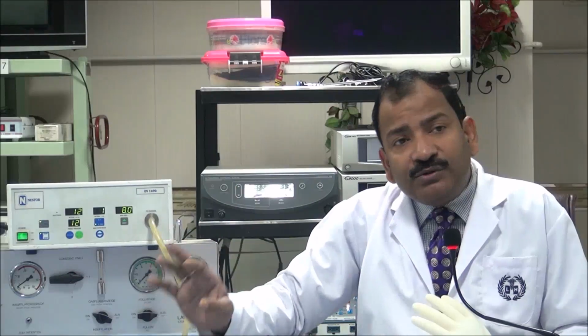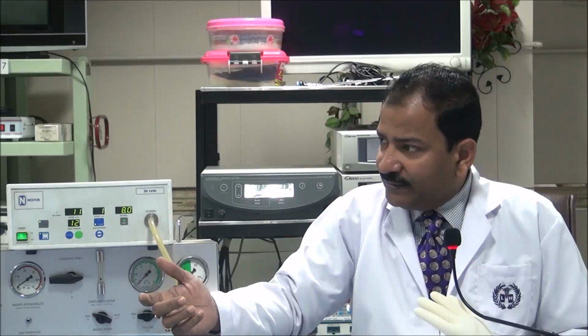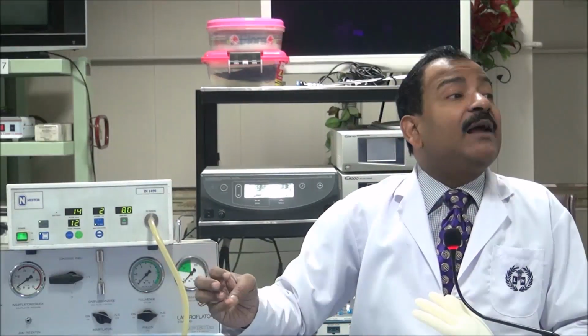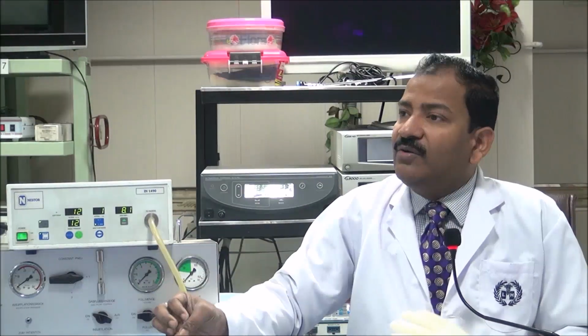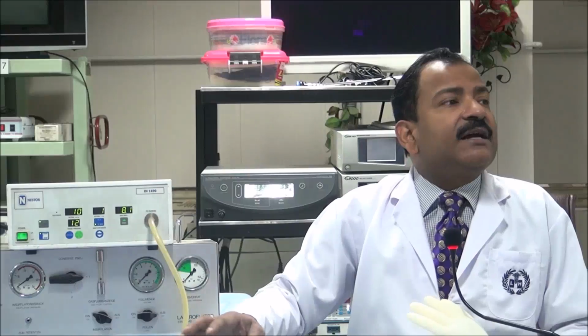Now, losing a lot of CO2, what are the disadvantages of losing a lot of CO2? First disadvantage is economical. I am losing the gas, money. Second disadvantage is that there is a chance of hypothermia. Patient was prone to develop hypothermia. If patient has not developed it, thanks to God. Isn't it? And third disadvantage is dryness of intestine.